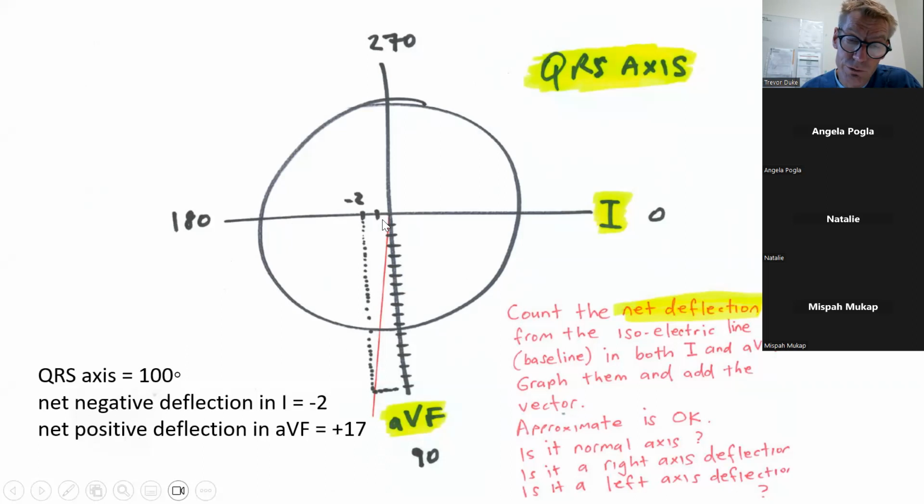And the reason in young infants there's a little bit of right axis deviation is simply because a baby at the time of birth has no difference in terms of the dominance of the right or the left ventricle. It's only after the birth that the left ventricle becomes more dominant, all right?